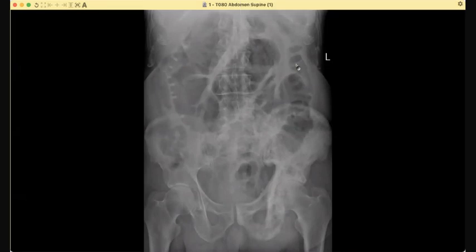As far as this film is concerned, that would be concerning for inflammatory bowel disease. That would explain the lead pipe appearance of this transverse colon. So I would like to correlate with the history of the patient and any previous images if available. Any other finding, other than the bowel, that you see on this film? Other than bowel, I'm trying to look at the bones.